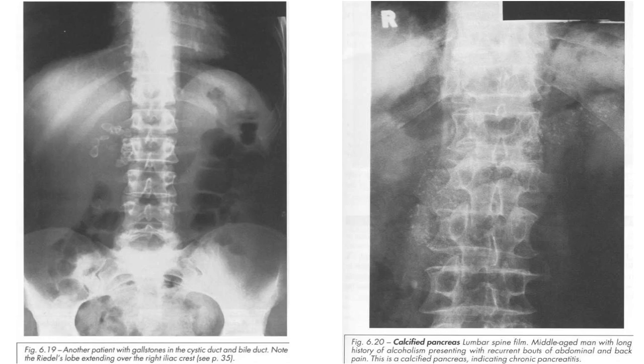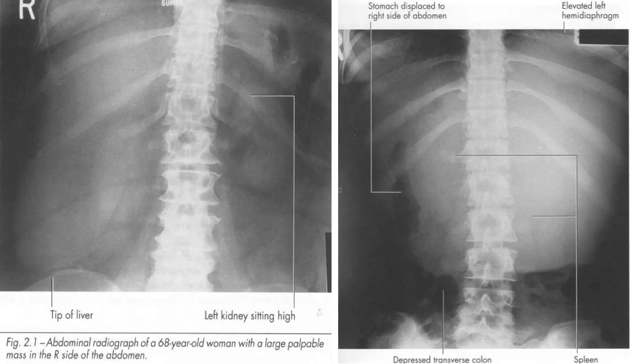Apart from calcifications, we have to look for any organ enlargement. On your right, you can see the liver. How big is it? You can find this first in the physical examination, then you have to be sure and compare with your X-rays or ultrasound.